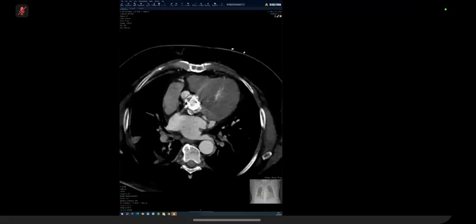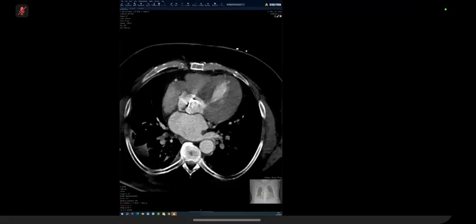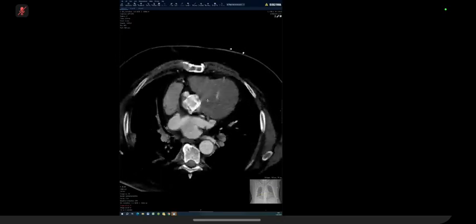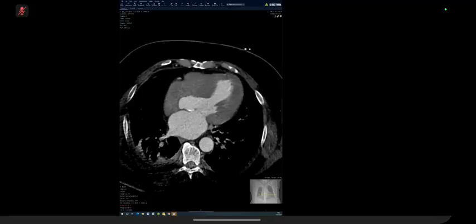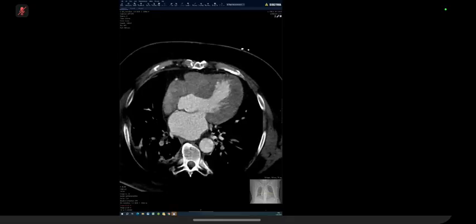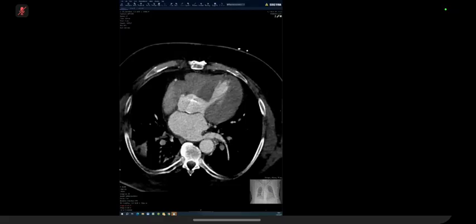Given the patient's symptoms and aortic valve replacement, I would consider asking the cardiologist to do an echo to look at possible aneurysmal dilatation of the aortic sinus. When somebody has surgery or intervention, the kind of aneurysms they get after that are pseudoaneurysms because the wall is deficient. That's the difference between a pseudoaneurysm and an aneurysm. A pseudoaneurysm is quite weak, an aneurysm is quite strong because an aneurysm has all the walls and a pseudoaneurysm does not. It is made because part of the wall was deficient, and that's how it was formed in the first instance.